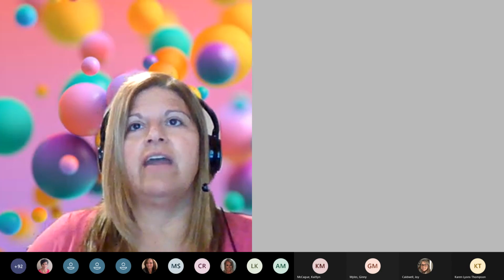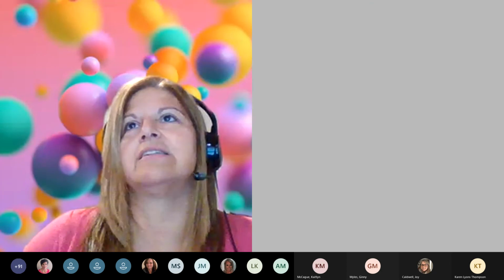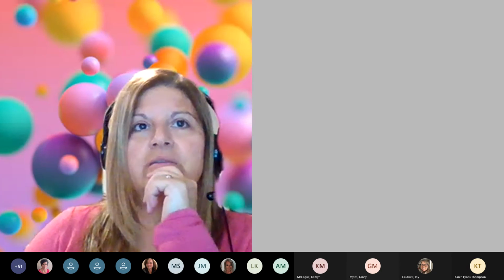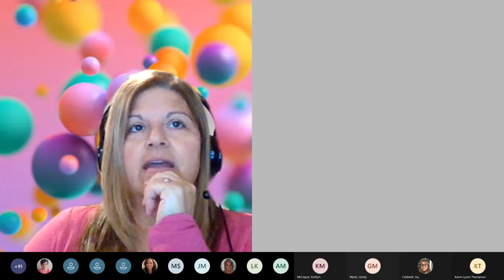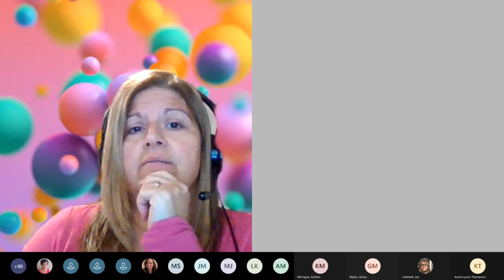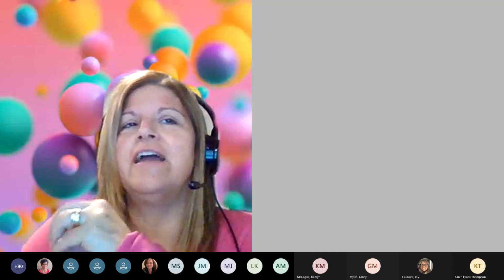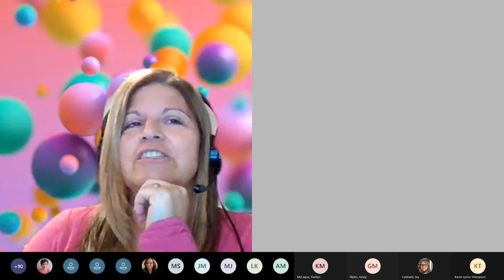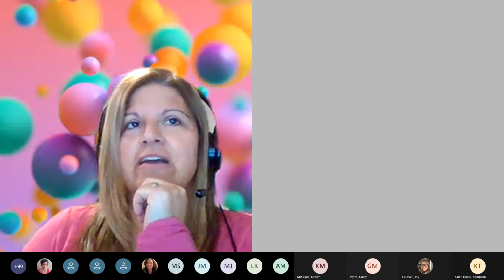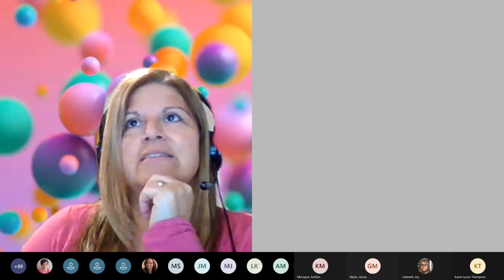I am going to go off camera just so we're not glitchy and you don't see me making funny faces. Here we go. And I just want to mention at the beginning that I am scanning armbands and scanning the products on paper. So if it doesn't work the very first time, just bear with me because it's just the angle I'm holding the paper, and it's a little easier when you actually have the product in your hand. So I'll do my best to make this work.